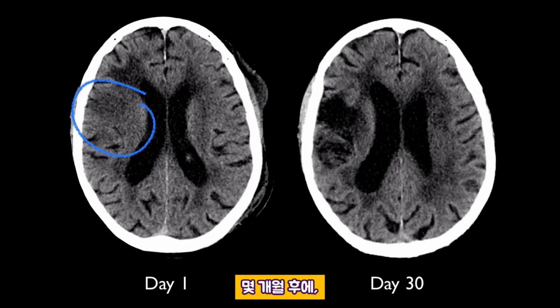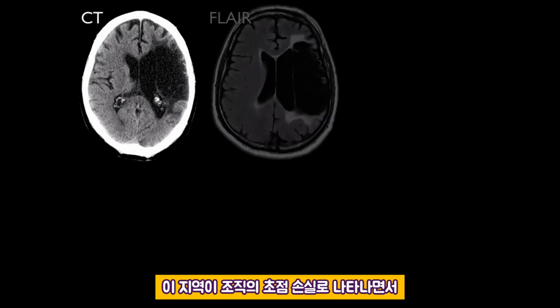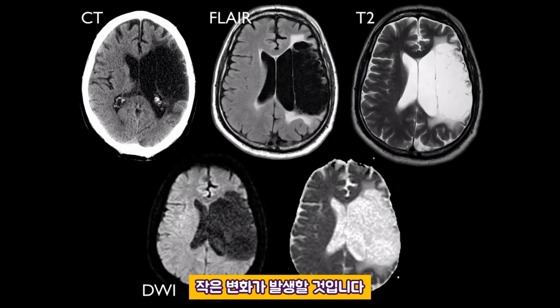After a number of months, little change will occur, with the region appearing as a focal loss of tissue, sometimes leaving a vague ghost of the previous gyral pattern, as seen in this patient, who had an infarct a number of years earlier. Note how all cerebral tissue in the region is lost, replaced by fluid, as demonstrated here, following CSF on all sequences including diffusion-weighted imaging and ADC maps.